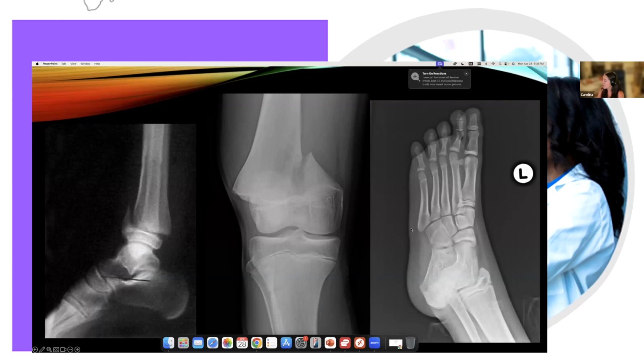I also wanted to show you that it's not only in these big joints, we also have Salter-Harris fractures in the smaller joints. I think for the sake of the dynamic, I'm just going to say it. I was going to see if anybody could find it. It's very subtle. I wanted to trick you, maybe see if you were paying attention. This is a fracture in the proximal phalanx of the fifth digit. And here we see the fracture is going through the physis and extending through the metaphysis.